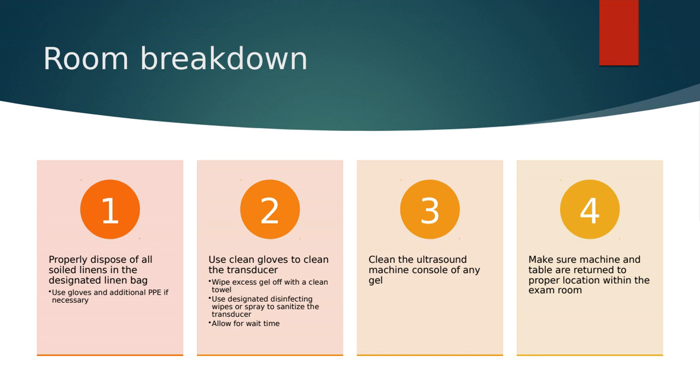Use a designated disinfectant wipe or spray, depending on what they have in your facility. And you want to make sure that you're allowing for wait time. So a lot of these really high-grade disinfecting wipes have a turnaround time on them, typically between 2 to 3 minutes, so that it needs to completely dry. You also want to make sure you're cleaning the ultrasound machine, getting any globs of gel off the machine, cleaning those highly used control buttons off, making sure it's nice and presentable and sanitized for the next patient.